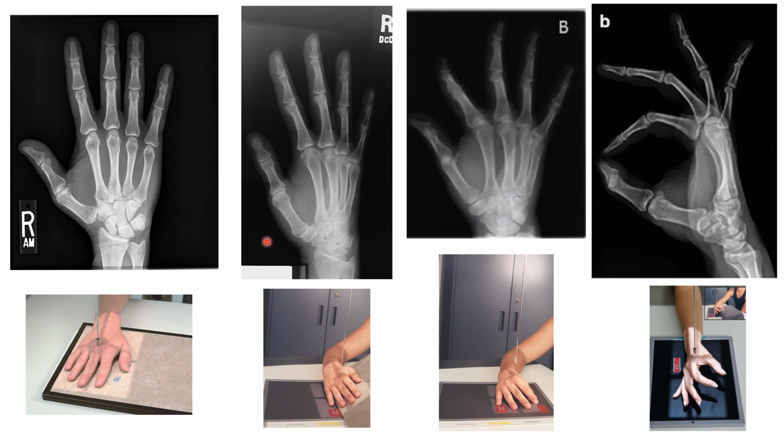The way they describe this is that we really should have no superimposition between the second and third metacarpals, but between the third, the fourth, and the fifth metacarpals, we can see the heads superimpose, as well as the bases. But between the shafts, we can see a little bit of distance. We want a little bit of separation at the shaft between those specific metacarpals.